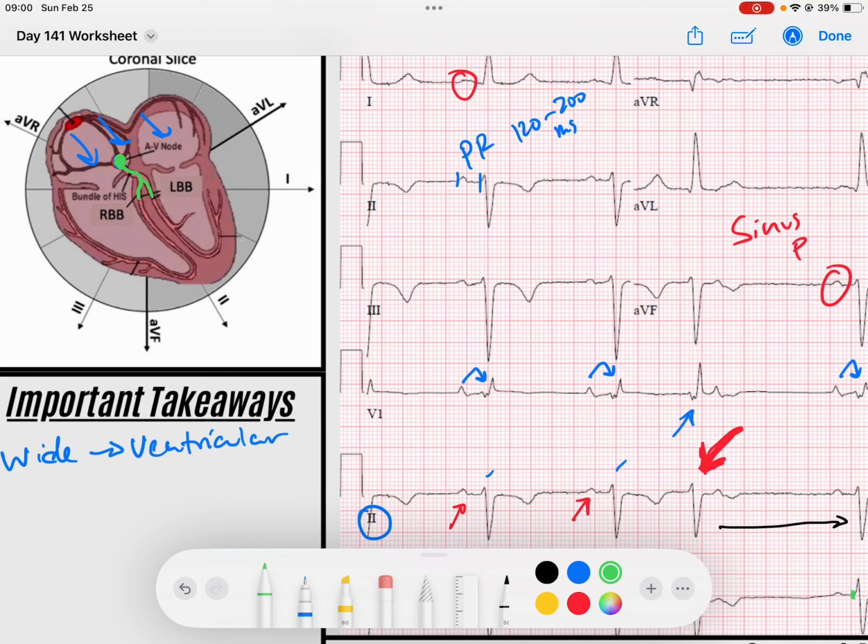You have a sinus bradycardia at a rate of roughly 55 beats per minute. You've got a right bundle branch block and left anterior fascicular block. If you would like, you can call that a bifascicular block. With left axis deviation, that might also be explained by some electrical criteria for left ventricular hypertrophy as well, drawing that signal even more to the left. And then we've also got evidence of a premature junctional contraction that causes a sinus P wave to be blocked.